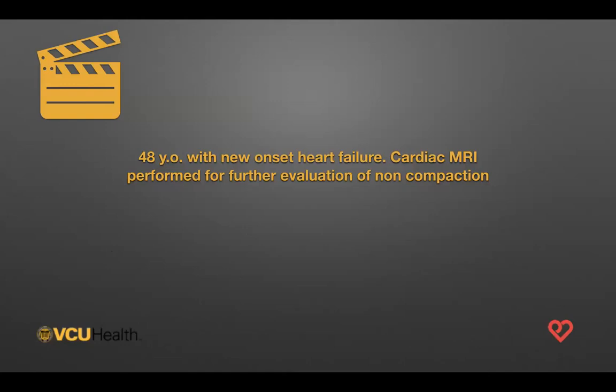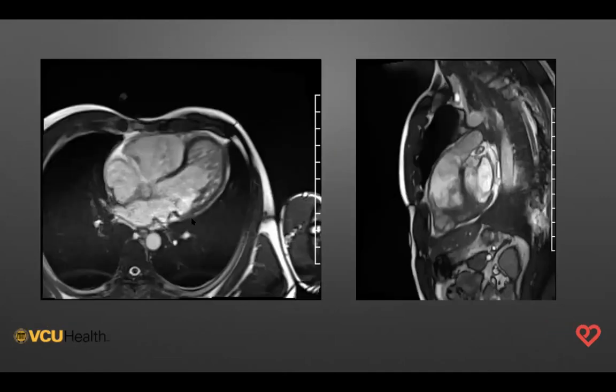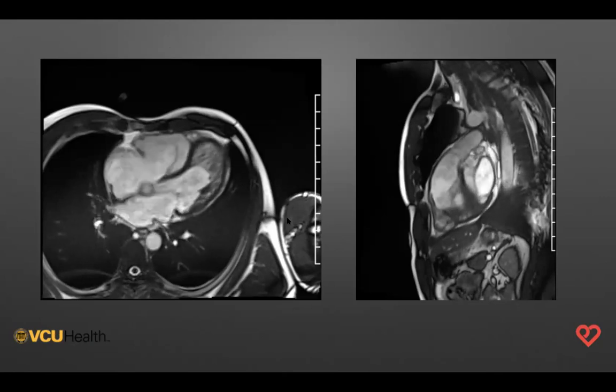So this is a 48-year-old who presented for cardiac MRI actually last Thursday. And he had new onset heart failure. And the reason that he was sent for the MRI is because they wanted further evaluation of the non-compaction, which is very reasonable. And what I'll show you is that these are his images.